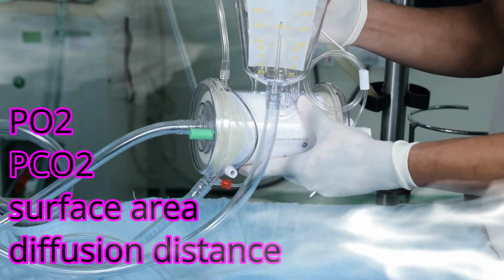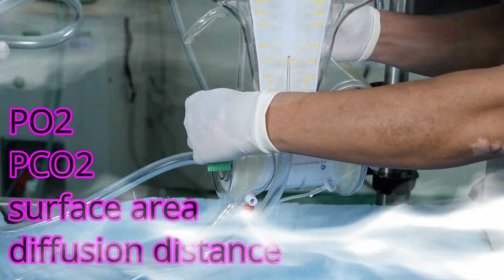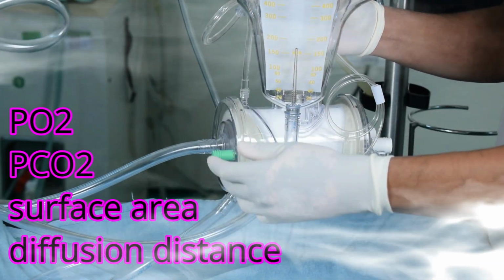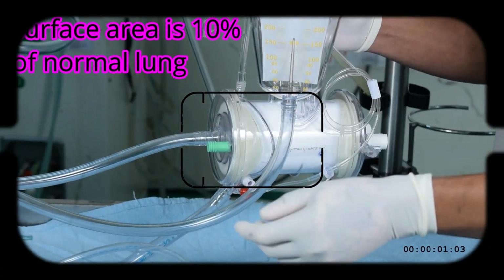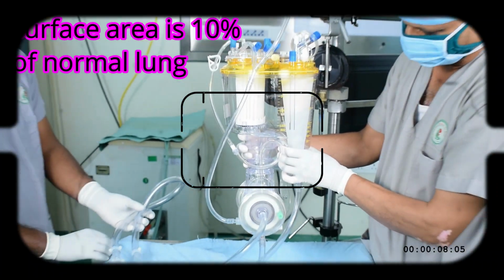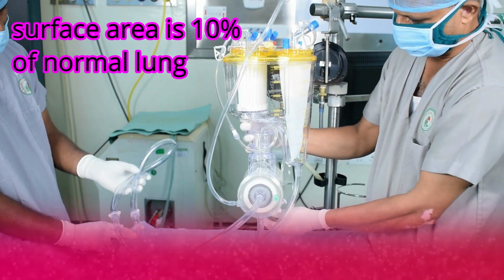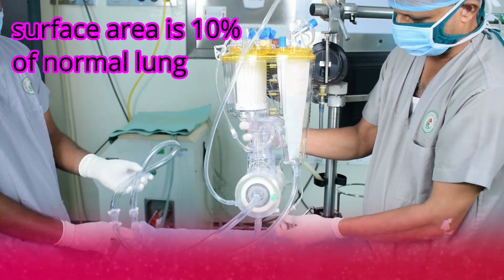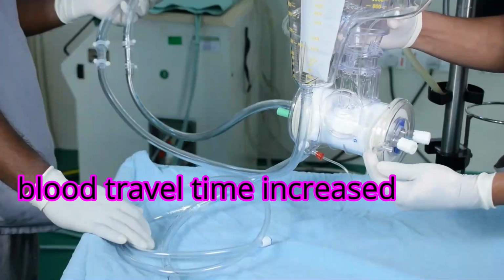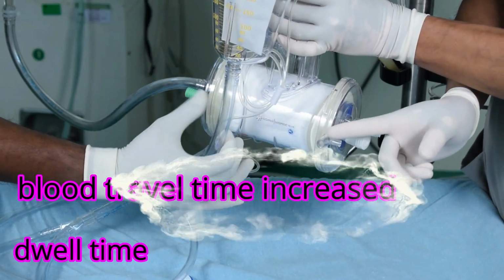So gas transfer across an oxygenator is directly proportional to the partial pressure difference of the gases and surface area, and inversely proportional to the distance of diffusion. Compared to a normal lung, the oxygenator surface area is only about 10%, and it overcomes its shortcomings in terms of surface area by increasing the distance that the blood would travel within the oxygenator for gas exchange to happen. The amount of time the blood takes to travel within the oxygenator is increased, thereby increasing its chances to exchange the gas, which is called dwell time.